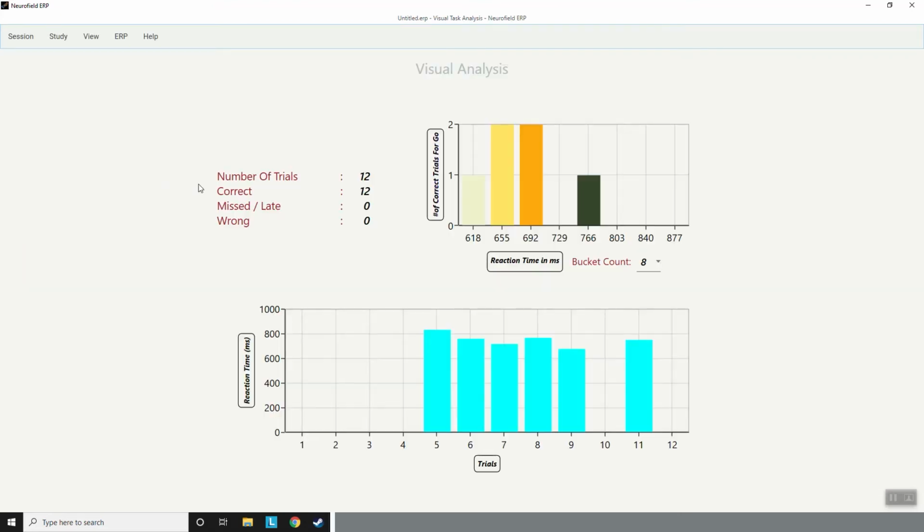And when you're done, the test will look like this. It'll tell you that it's done. You exit the task. And then you can see the responses. How fast is a person responding, and what's their average time. That's great. It stores that information. Later on, when they take the task again, you can actually conduct a study here and look at the differences between test 1 versus test 2 and so forth. And you can actually plot that data and then print it out or create a Word report for it.